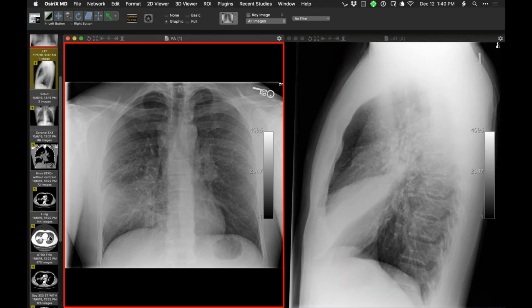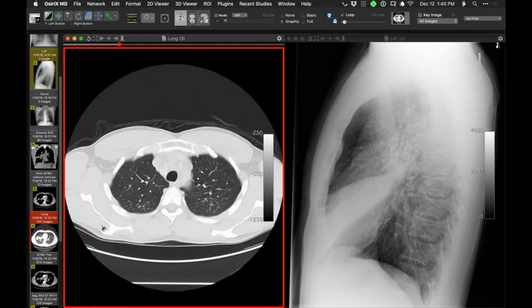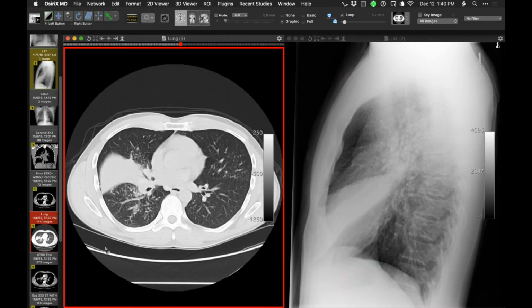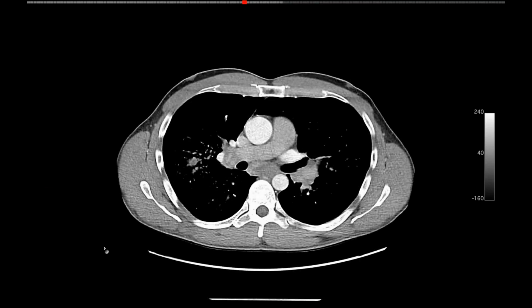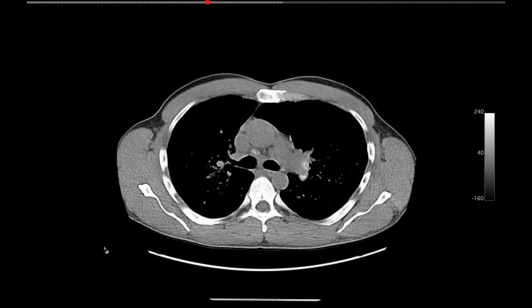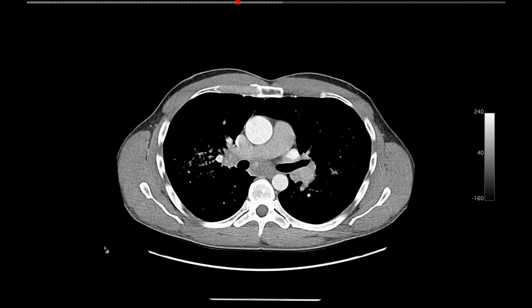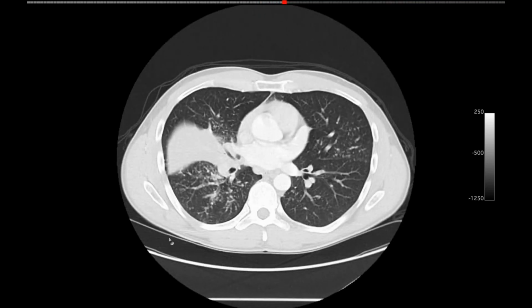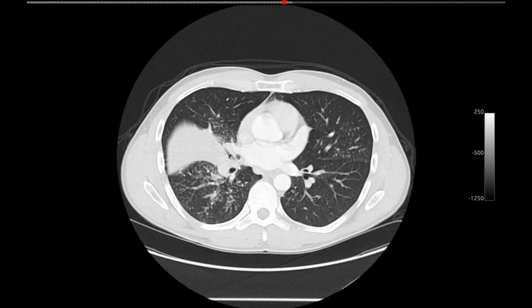So three things. When we look at the CT, as you already expect, we'll see nodules, the typical appearance and distribution of sarcoidosis. In looking at the lymph nodes, we see the same finding, big nodes. Some have the amorphous calcium, which one sees pretty typically with sarcoidosis. What's really interesting in this patient is not so much that, but the right middle lobe atelectasis. If we look at that, we can see that, yes, we have air in the medial segment.